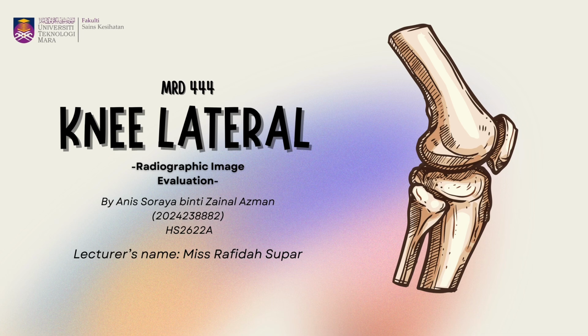Today, I will be presenting about the lateral knee projection. In this presentation, I will talk about the radiography anatomy of the lateral knee, the positioning criteria and also the exposure factor criteria. And most importantly, I will evaluate the radiograph of the lateral knee projection based on the AZMAN method to see whether the radiograph reached the good criteria for good image quality, and to see whether the radiograph is acceptable or rejected. Now, let us get started with the presentation.